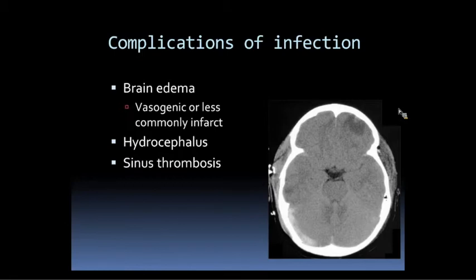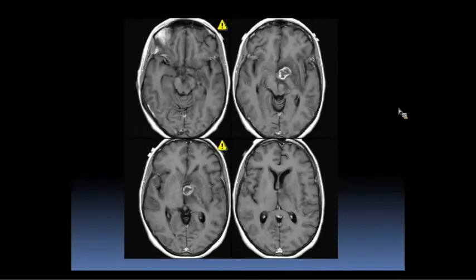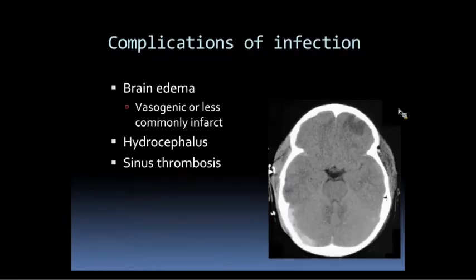Just another thing you want to also be concerned about in basal ganglia infections in an immunocompromised patient, HIV, is of course cryptococcus also, and that typically is best seen on MR, not well seen on CT, because the hallmark there is actually enlargement of the perivascular spaces, which is kind of a subtle finding to see on CT. So, we talked about some of the complications of infection, like hydrocephalus, uncommonly infarct, but certainly can happen.